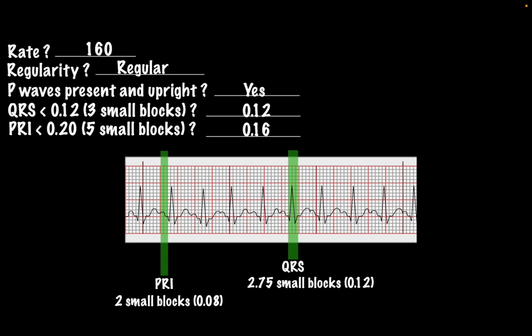Now, the rhythm you're looking at is actually kind of a trash can term for a lot of different rhythms. And there's a lot of different causes. It's called SVT, or supraventricular tachycardia. Now, pay attention to that name, supra, above the ventricles. Now, there's a lot of causes for it. It shouldn't be mistaken with sinus tach, and I'll kind of break that down in a little bit. But this is different than a chronotropic response to exercise or hypovolemia.